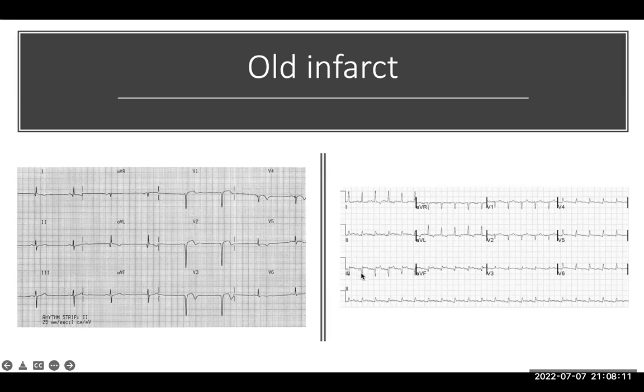Like in this ECG on the right, sorry, where my arrow is, you can see there is Q wave in the inferior leads, in lead 3 and AVF. And this is an old infarct in the inferior leads. Old does not necessarily mean it happened last year. No, it's possible that it even happened 2 days ago.